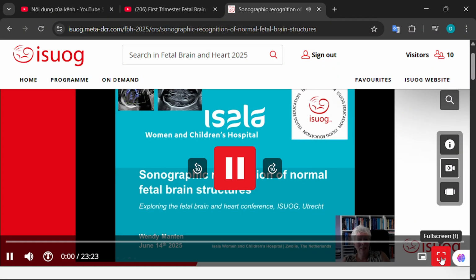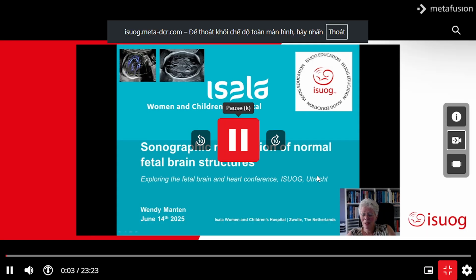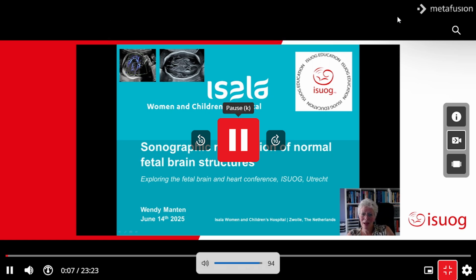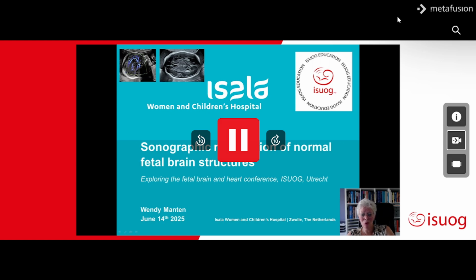Because of the online character of the course today, we were not able to provide a live scan, so we decided to do a presentation about the sonographic recognition of normal fetal brain structures instead of the live scan.